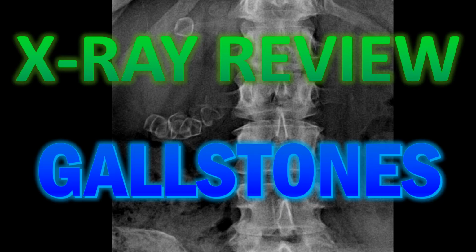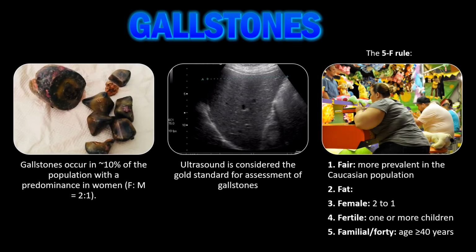This video is about the radiographic appearance of gallstones. So let's look at a few key features of gallstones. First, they're very common. Gallstones occur in approximately 10% of the general population with a female predominance of 2 to 1. Second, you can have gallstones, get an X-ray taken, and not see anything. Not all gallstones show up on an X-ray, but they do show up on ultrasound. So ultrasonography is the gold standard for assessing for gallstones.